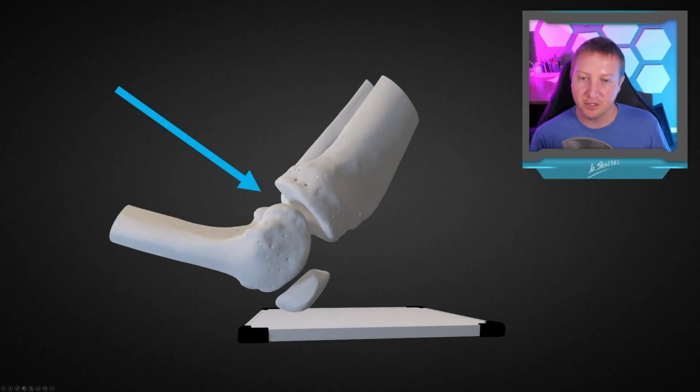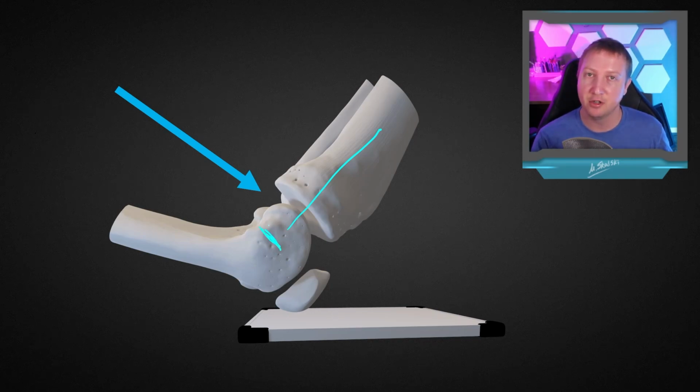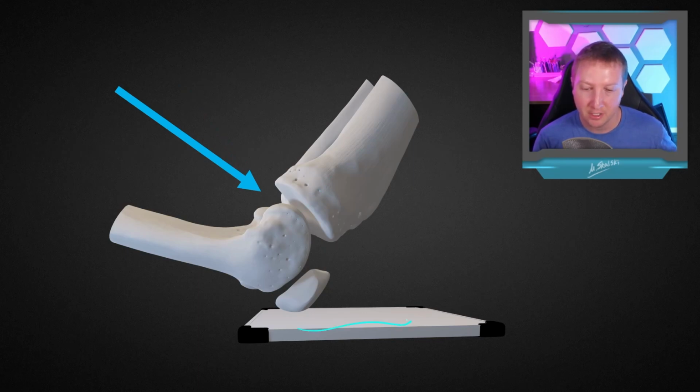So now let's talk about this tunnel view. And I think it's important to understand how this tunnel view is taken. So the patients, for most of the times when this is taken, not always, are going to be prone. That's the standard way to take this, with the knee flexed up like this so that we can shoot down right along Blumensaat's line, parallel to the roof of that intercondylar notch. And the way I drew this arrow is probably a little bit too steep. Probably down like that would be a little bit more accurate. And then, of course, our cassette has to be shifted down here to catch that.